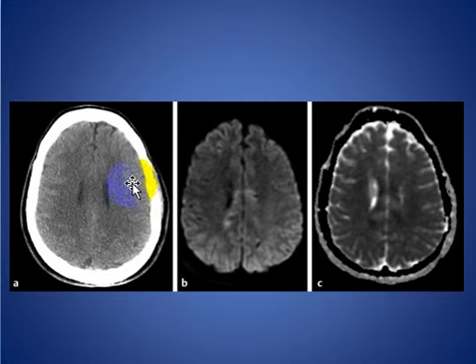Here another patient with trauma, and we see here in the brain CT scan the patient has edema, but in the diffusion weighted imaging we see extensive axonal injury involving the corpus callosum here, indicating a restriction, and also in the parasagittal gray-white matter junction bilaterally. And this is hypointense in the ADC map.